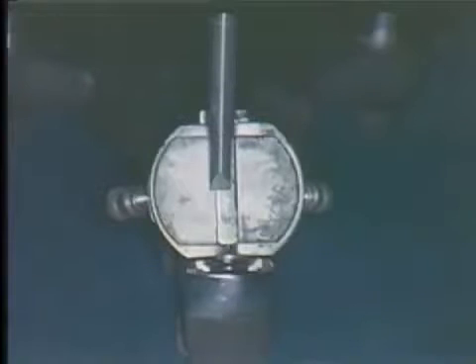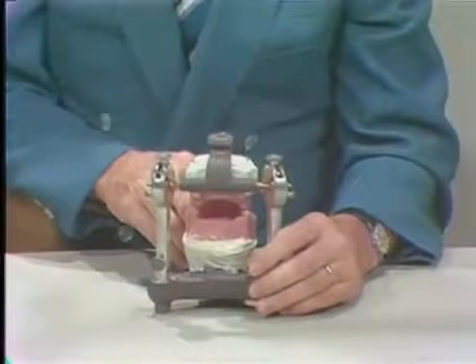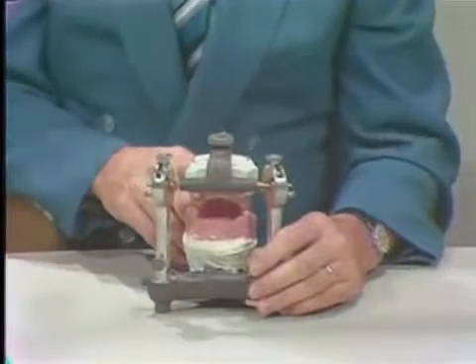Now when we go to the next slide, which still perpetuates the error, as you set your incisal table, you can see it's not centered, so you're going to be off in your lateral inclination. So this is an error that we would not want you to have, and we're going to show you now how to correct this on the articulator, and this is also demonstrated to you in a handout.